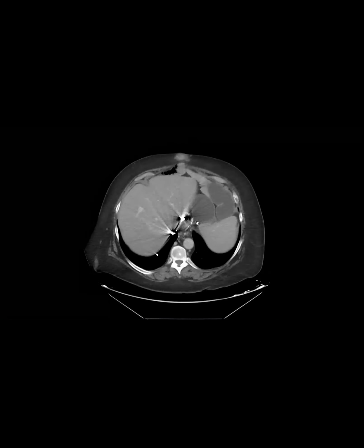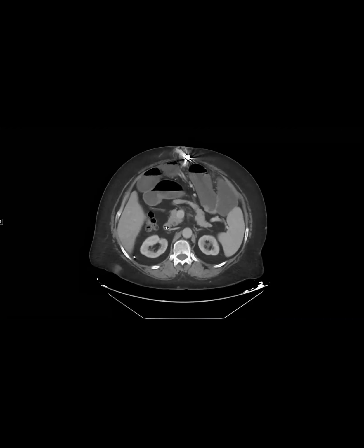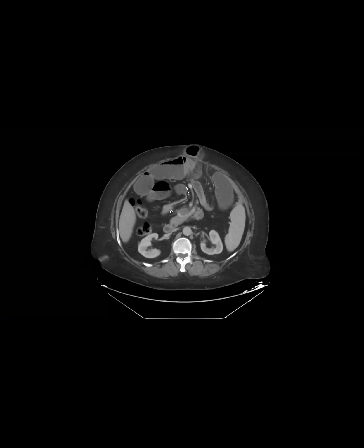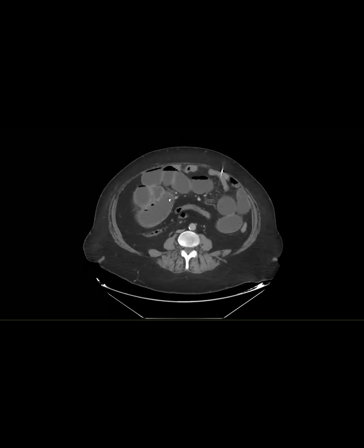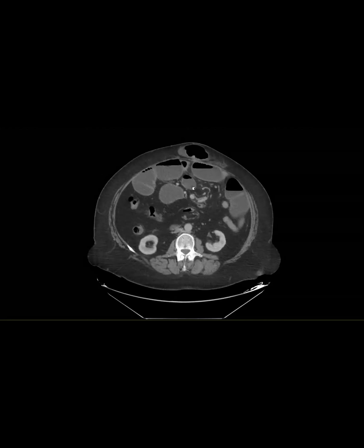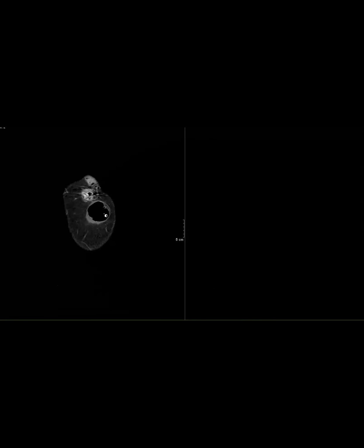And she also had a bypass. So when I followed the bowel, you can see here, the proximal jejunum is decompressed. And then all of a sudden you get into this compressed area, and everything beyond that is markedly dilated. And then distally, this piece of hernia was the obstructing one. Based on coronals, you can see it nicely as well.